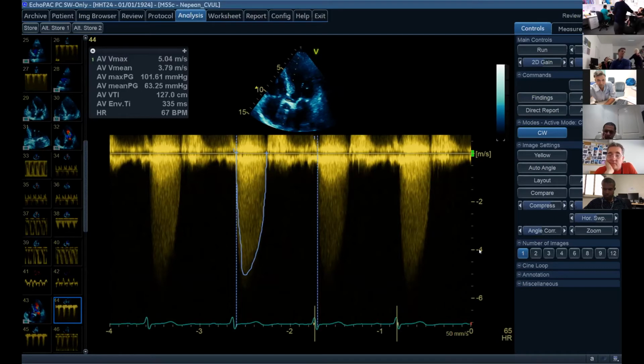Yeah, I agree. I think the one thing which is against MR is it should be the whole... Yeah, and when we say against, yeah, absolutely. So it's only the early systole. So probably it's possible it's aortic and it's severe. Yeah. Because MR should fill more of the cardiac cycle.